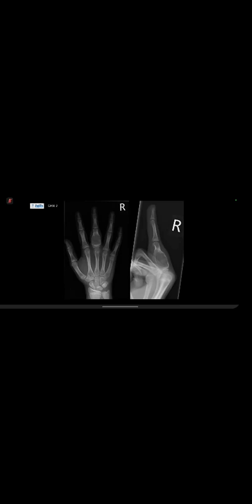And here you can see it's a central diaphyseal, usually expansile lesion, and you can see that nice thinning of the cortex and the endosteal scalloping that occurs with these lesions, most commonly in the hands and feet. And you can get pathological fracture, so I was pleased that you were looking at the cortex and looking for some periosteal reaction. So again, a nice summary slide here for you all. They're benign tumours, and the peak age is 10 to 30 years. So half occur in the hands and feet.